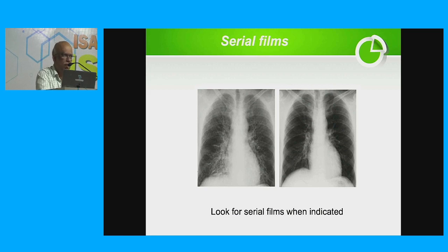In the first, yes. Suppose the patient after a TURP surgery has disorientation and restlessness, you take a chest X-ray, this was the X-ray, and the patient later develops pulmonary edema, and is put on a ventilator. Then in the evening you take a repeat X-ray, and it becomes clear. So that means the patient has improved. Or after dialysis, a patient who was pre-dialysis. So with these sort of patients, you have to compare with the older films, or after therapeutic intervention, after dialysis, after ventilator therapy, it clears like this. So this is the importance of comparing with the previous films.